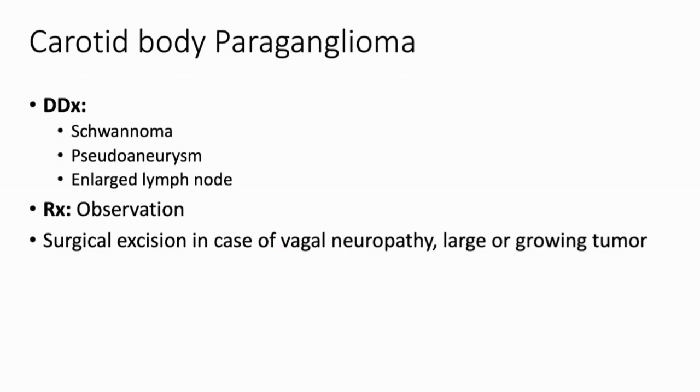These are nuclear medicine scans. They are very specific for neuroendocrine tumors such as paragangliomas. And paragangliomas can also occur along the sympathetic chain. So usually we can screen for other paragangliomas along the chain by having a PET scan or an octreotide scan.